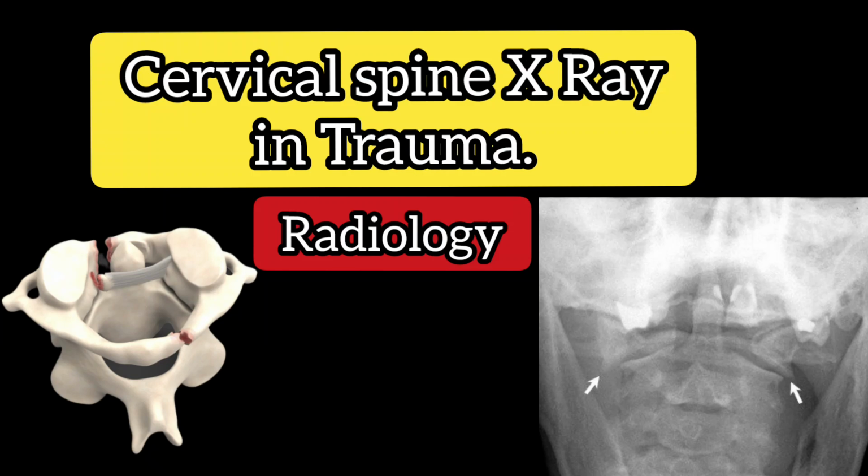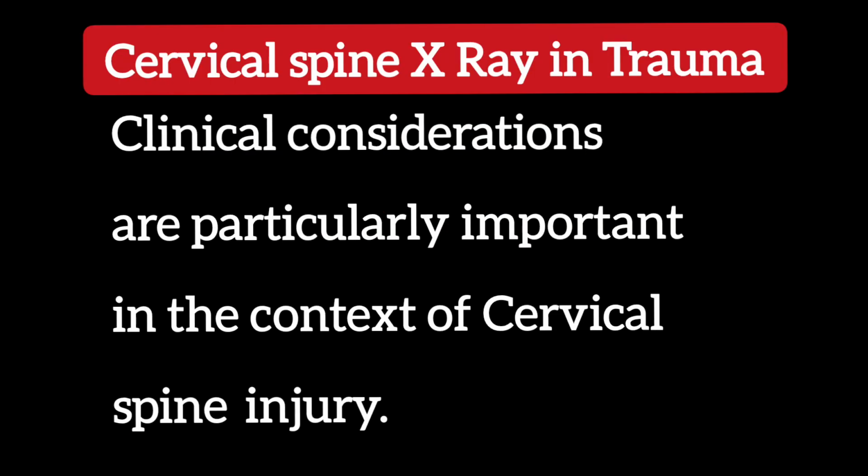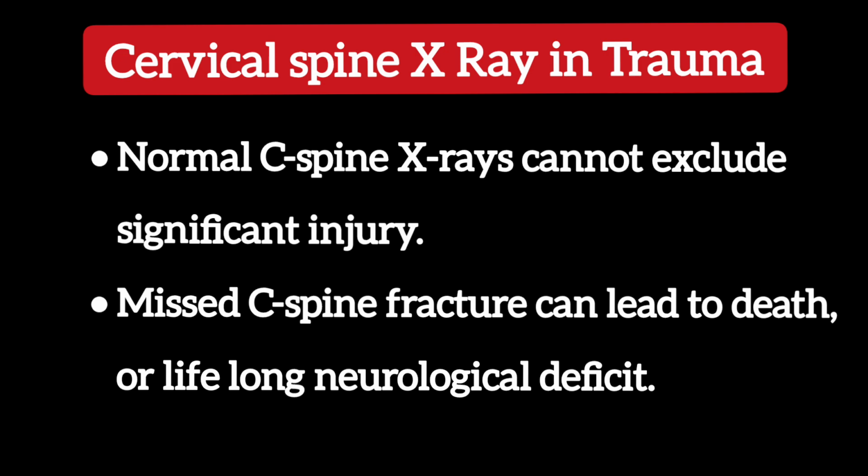Cervical spine X-ray in trauma. Clinical considerations are particularly important in the context of cervical spine injury. This is because normal C-spine X-rays cannot exclude significant injury and because a missed C-spine fracture can lead to death, or lifelong neurological deficit.